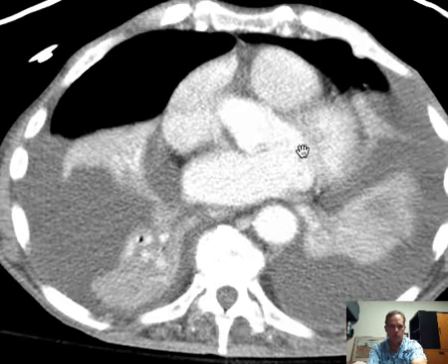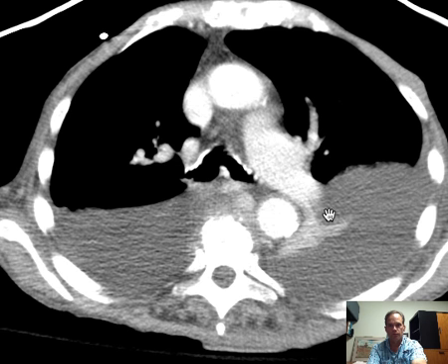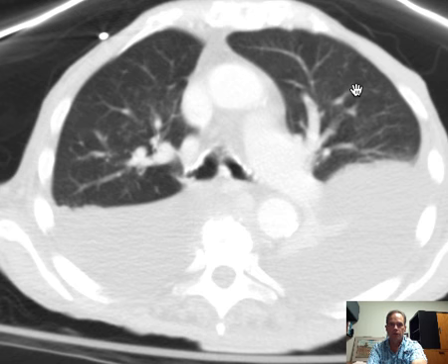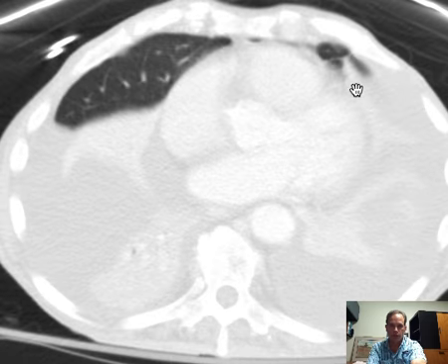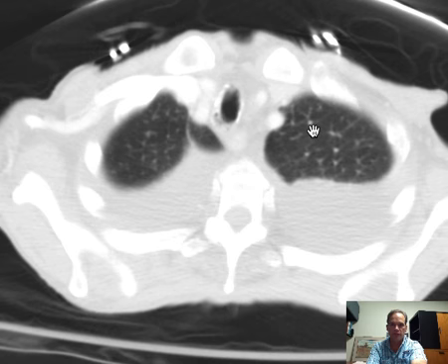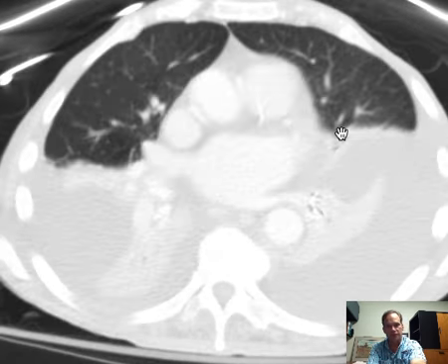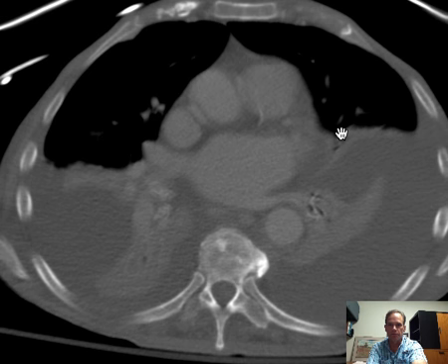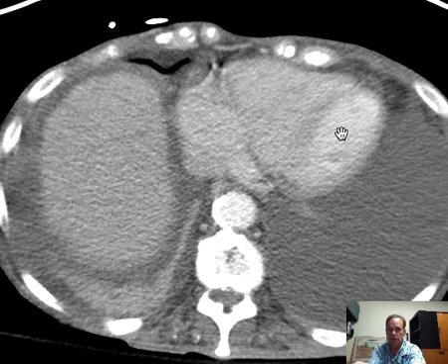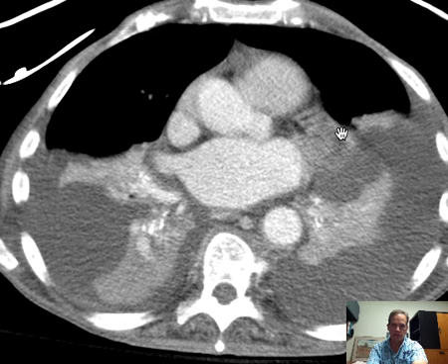So look at the pleural fluid and see what it's doing to the lungs. Look at the lungs. Now here you have aerated lung, and you can see, changing the windows to lung windows, and that's what these are called, lung windows, demonstrate the vascular branching within the upper lobes, which seem less affected by this pleural fluid. But other parts of the lung look abnormal. How would you characterize that abnormality?